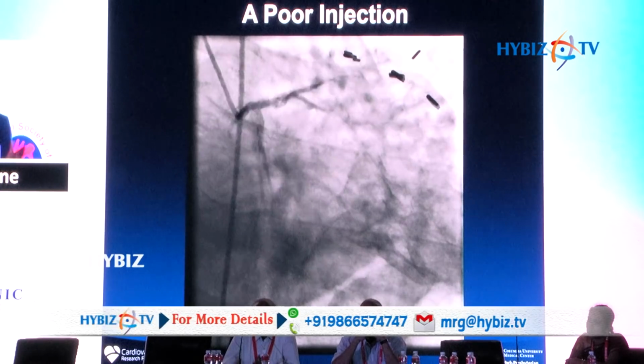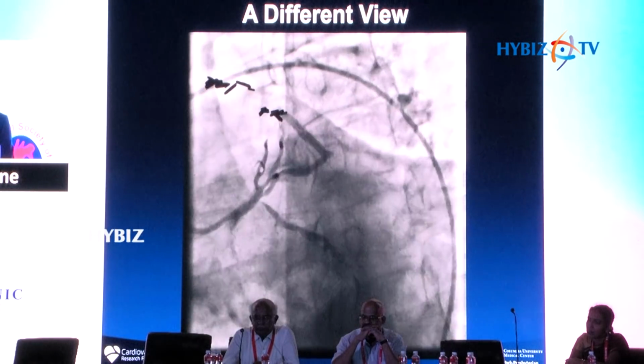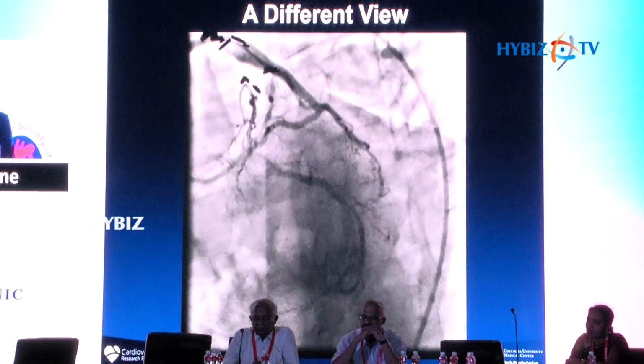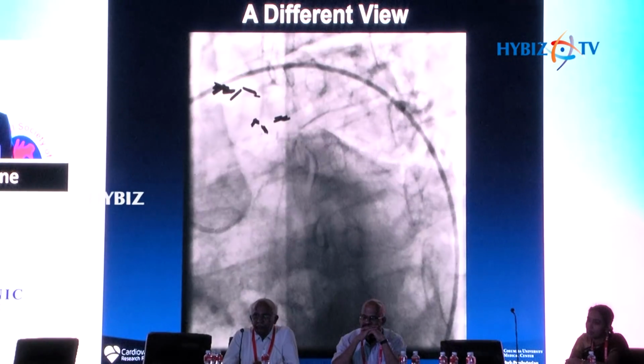But this is just a typical AP caudal or RAO caudal type of view. You take the same exact patient in a different view with a better injection, and now you see how severely stenosed the ostium of the circumflex is.